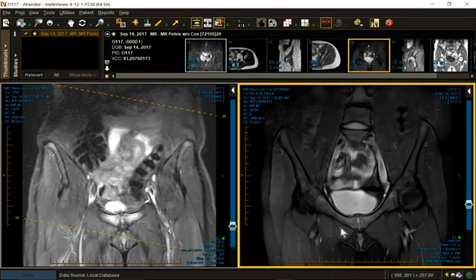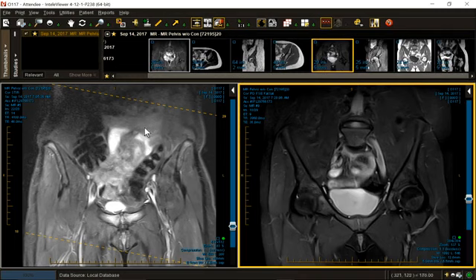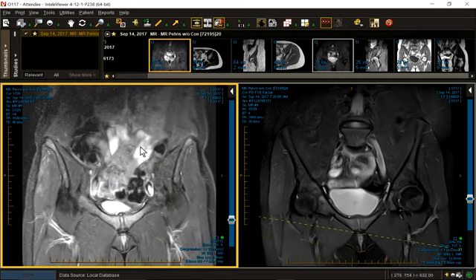My adductors and pectinei are perfect, but not my pubis. Actually, my pubis is fine. His pubis, not so good. It's a kid, right? A cross-country runner. He's only 14. What's he doing with this large edematous pubic capsule? We said the pubic capsule could have some signal in it about 10 millimeters long. This is the entire span from top to bottom of the pubic capsule, distended, widened.